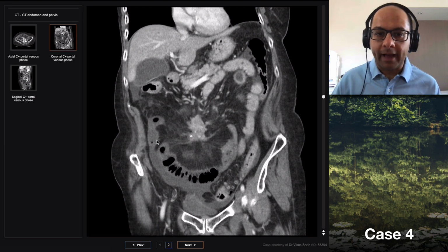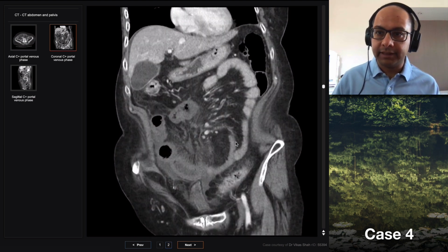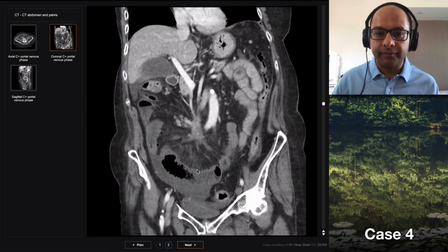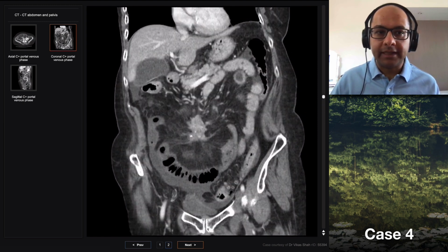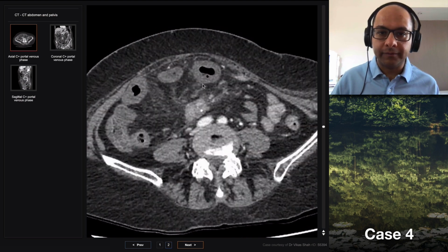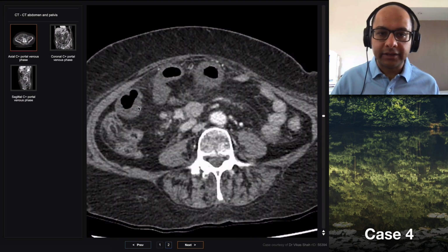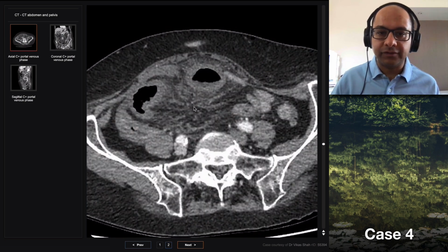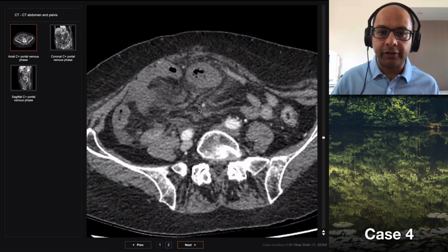And all the small bowel that's supplied by that part of the mesentery is abnormal. The abnormality is this really marked thickening of the small bowel, but with low density of the bowel wall. So everywhere you look, the density is quite low, but it's very, very thickened. And then there's really marked congestion of that small bowel mesentery.